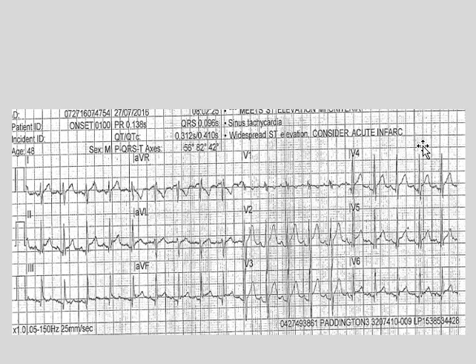And what else stands out? These ST elevations. Look at V5, beginning with V4, V6, but also in V2 and V3, all your septolateral, all your anteroseptal leads. Consider an acute infarct. Well picked. In all of these, of course, you should always look at your QT intervals. We haven't been doing that, but there's always a possibility that you would have long QT syndrome.